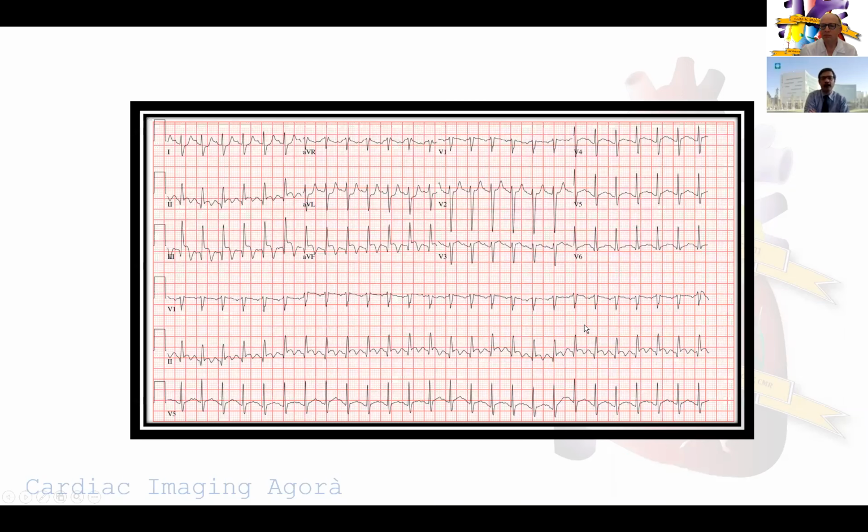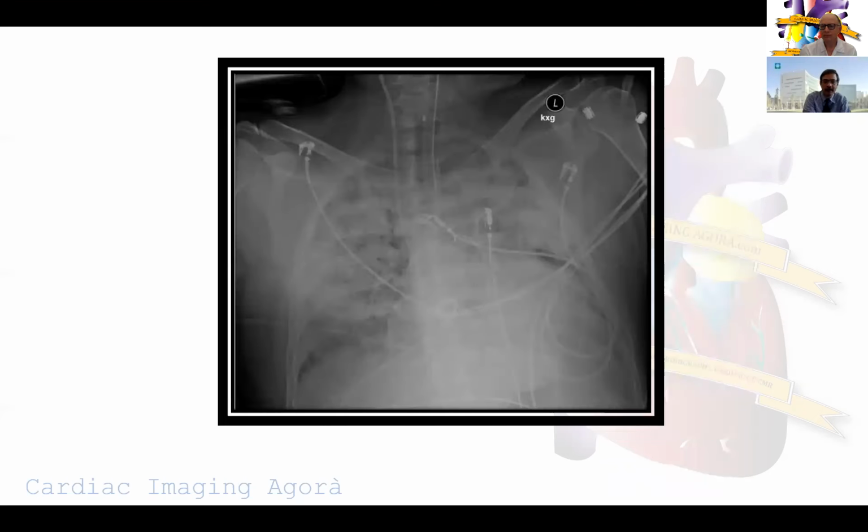Here's a patient we saw recently, comes in, short of breath, in pulmonary edema, hypotensive. Here's the presenting EKG, and you can see the patient is very tachycardic, in sinus rhythm, but there's ST elevation in the inferior leads. And along with that, there are Q waves in the inferior leads too. So you suspect there's a subacute inferior wall myocardial infarction going on with this presentation. Here's a chest X-ray, and you can see the chest X-ray shows bilateral pulmonary edema, and you can appreciate why this patient is in trouble.